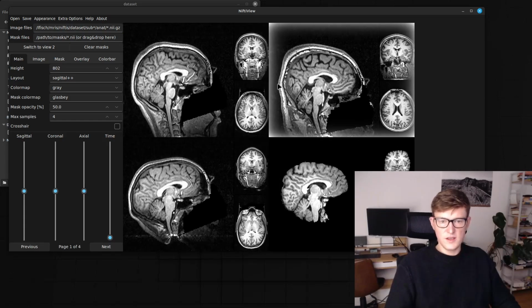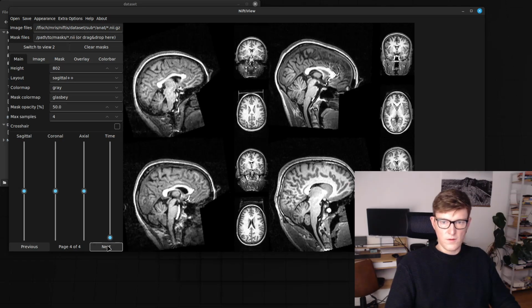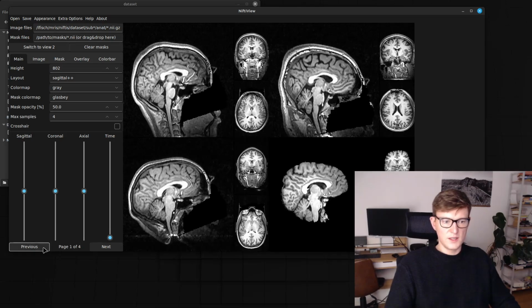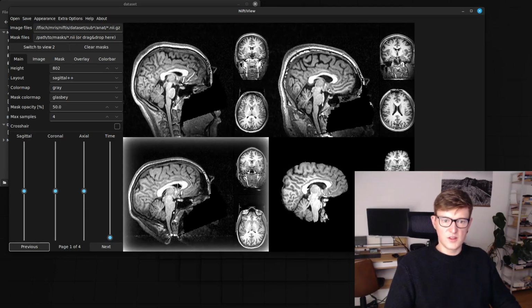And as you can see, we have 1, 2, 3, 4 times 4, 16 images in this directory. And you can also see this makes quality control much easier, because we have now already identified one anomaly. So this one is skull-stripped and the other images aren't.